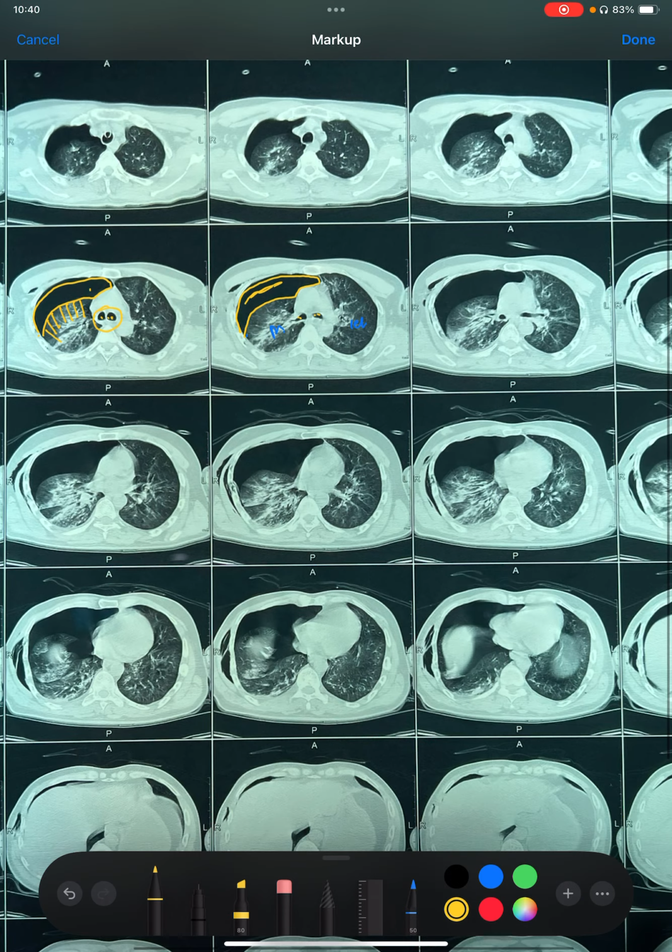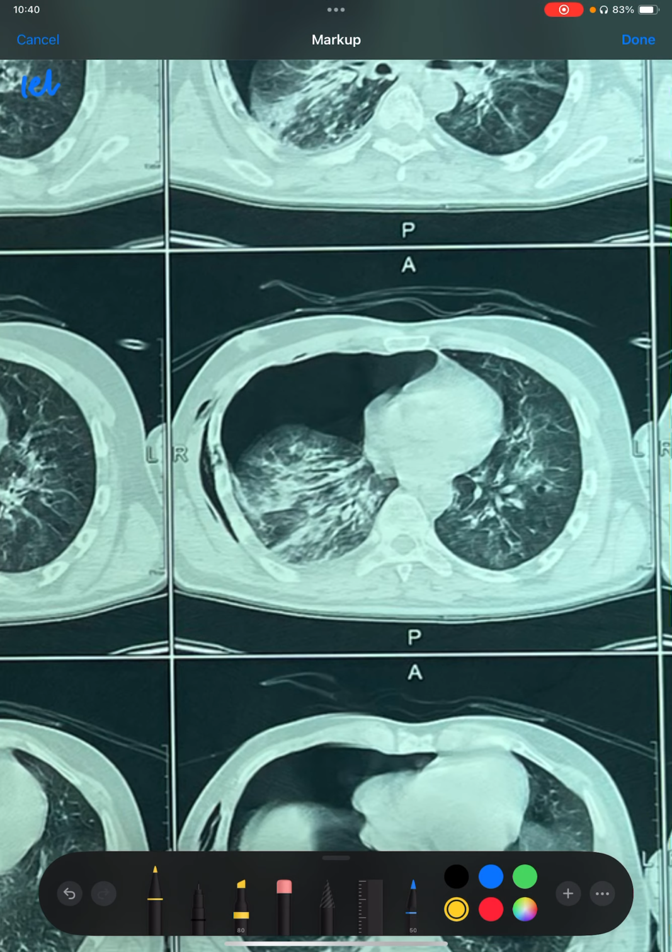Here also we can see that this left lung shows so many dense white lines, and it appears to be significantly shrunken on the left lung field, which highly suggests that there is definitely significant restrictive lung disease also.